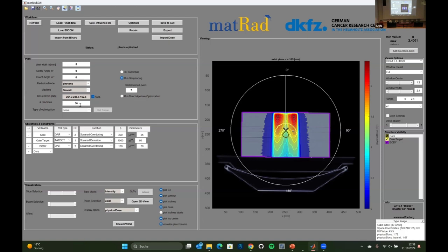It has reasons related to ion therapy, where you have biological models with a non-linear dose relationship to response, and then you cannot normalize that easily. So you always need to do a little bit of thinking in your head. I like it in educational settings, especially with school children, because if they are in higher school, they can calculate it in their head directly, and they're happy that they can calculate something. This means it's like 60 gray in 30 fractions. The standard setting is 50 gray for some reason in the data, so this would end up with 50 gray in 30 fractions.